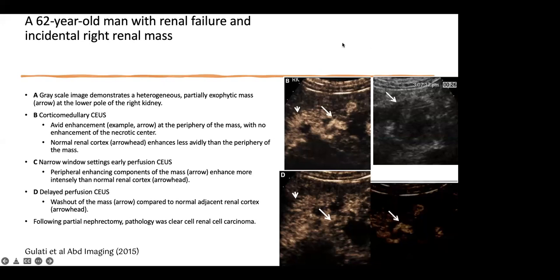Actually, like you have described, we need to look at the phases that we expect after injection of the contrast. So we have to see the different attenuation of the lesion versus the normal renal parenchyma, and the uptake of the contrast in the lesion versus the rest of the normal renal parenchyma, and we compare that because there is new vascularization and hypervascularity in these lesions.